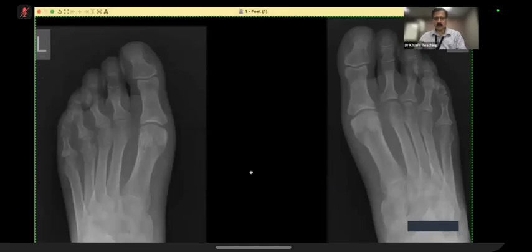If the examiner pushes you, you can tell your thinking process that in differential, I can consider CPPD. However, this is not the age group of CPPD. And I would like to see the calcaneum, for example, to see any enthesopathy there. This is not gout for the reasons which I have told you. So you have to develop this kind of thought process for your exam.